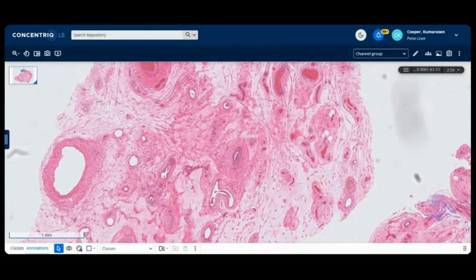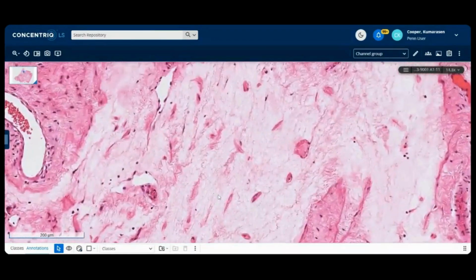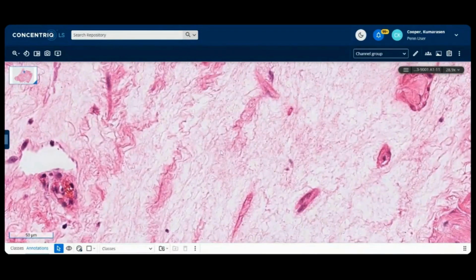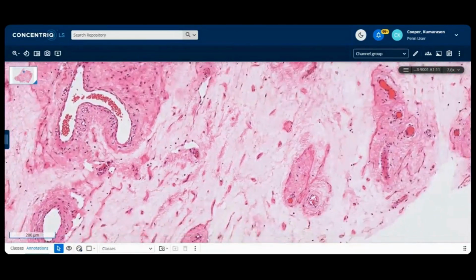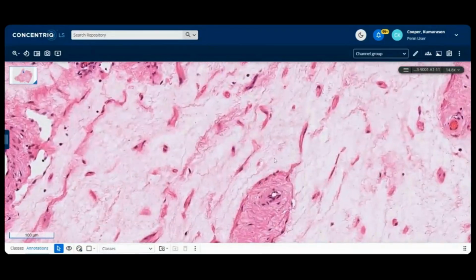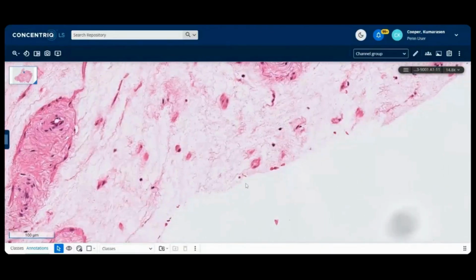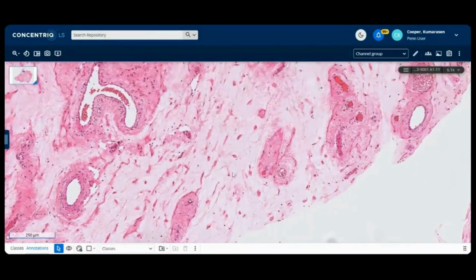But here you can immediately see lots of vessels, okay? So the stroma here, you may say on low power looks myxoid, but I hasten to add that I think it's more sort of edematous. I think this is water. It's fluid, edema, right? I don't think it's myxoid. And the reason I'm happy to say that is because if you look at the background, it's white, and this is also white. Similar to that synovial sarcoma, I think it's more edematous rather than truly myxoid.